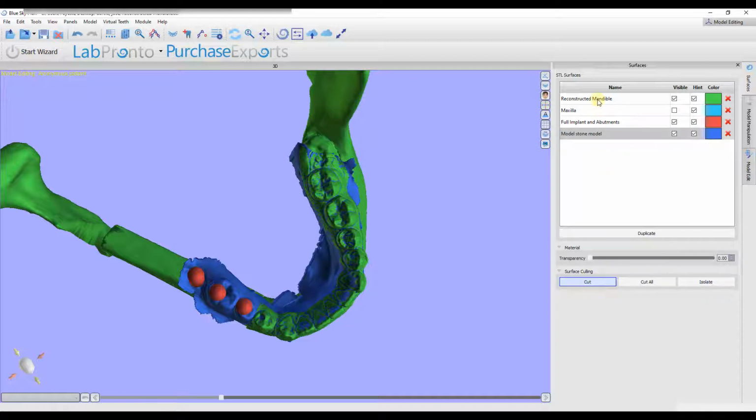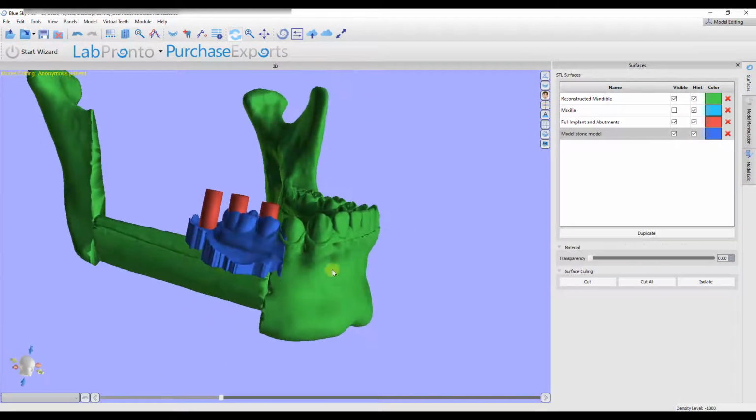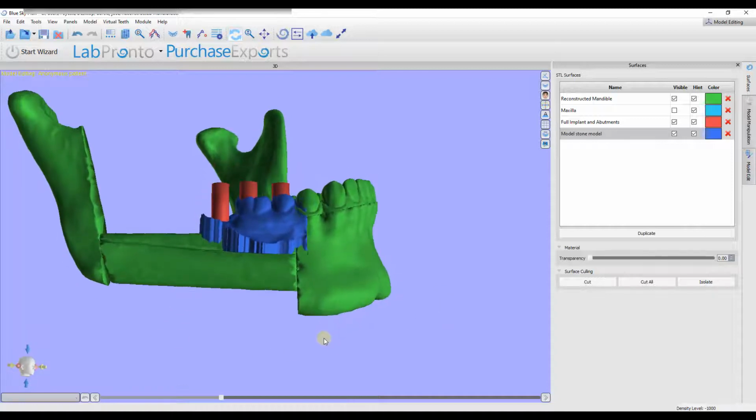And you've always got to choose, before you use the cut tool, which model you want to work with, so it knows which model to cut. And then with this, I'm going to go around the blue. And I'm not going to cut it too close here just yet. And when it makes this cut, I'm going to turn off this cut tool again just to move it around a little. And I'm going to make a little cut from the side here.